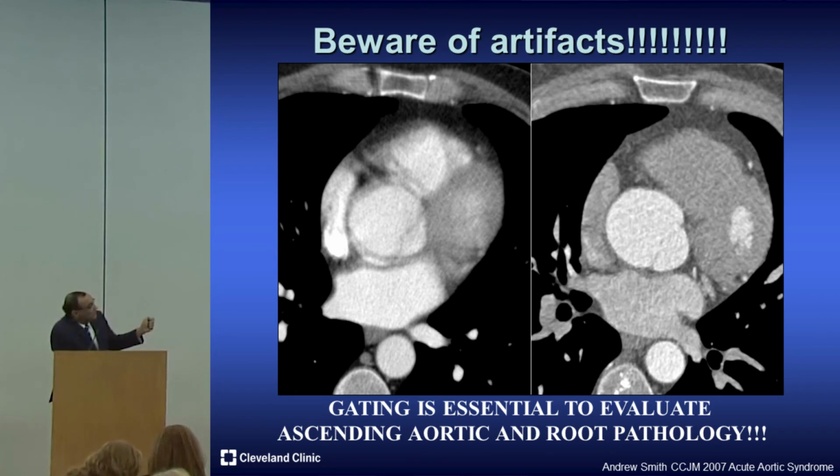The image on the left is where the technologists did not use something called a gating technique. This was an image performed at a smaller hospital where they do not have the appropriate software, or they don't like to use it, or they don't know how to use it. This patient was flown in with complaints of a dissection. We looked at that, we suspected that this is motion artifact. We repeated the CAT scan, we cured the dissection with just a CT scan, okay?